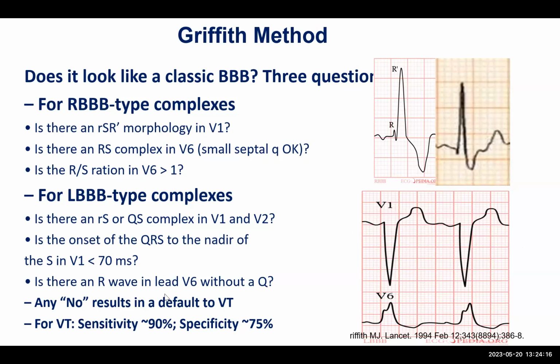Its sensitivity is about 90%, specificity about 75%. So what I usually do, I use this as the initial part. Then I look for other criteria for VTAC.